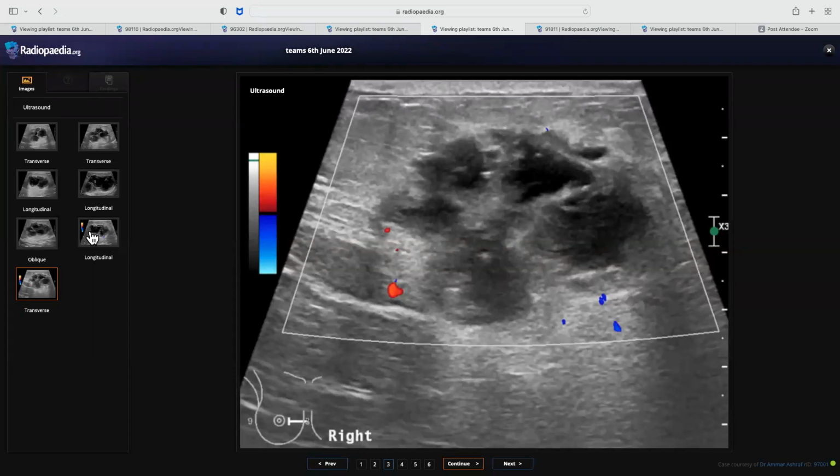Based on these images, you think it's a benign lesion? Based on the mammogram as well as the ultrasound, actually, there is no central vascularity. But there are a few calcifications. So I would now grade it as U3 rather than U2, and advise a biopsy of the lesion, followed by further management and staging if it turns out to be malignant. Before that, anything else you do when you see a mammogram?